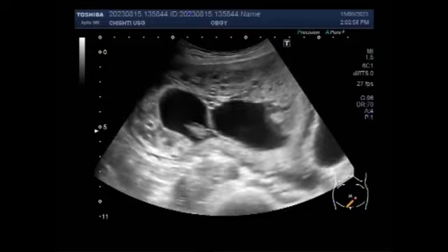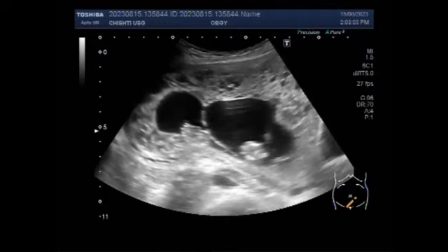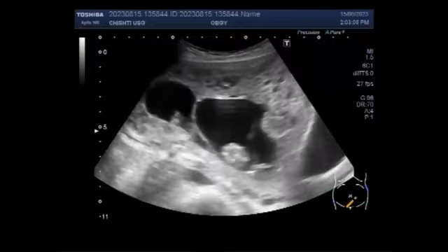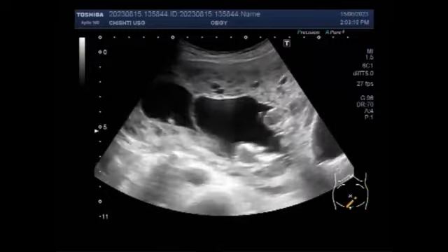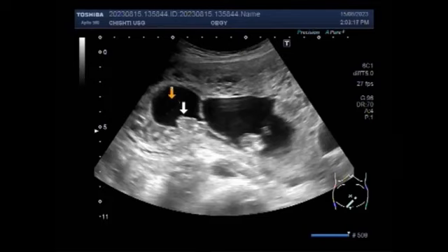Twin molar pregnancy with a hydatidiform mole and coexisting live fetuses is a rare form of gestational trophoblastic disease associated with an increased risk of obstetric complications and poor perinatal outcome. Prenatal diagnosis is essential to couple counseling and follow up in tertiary reference care.